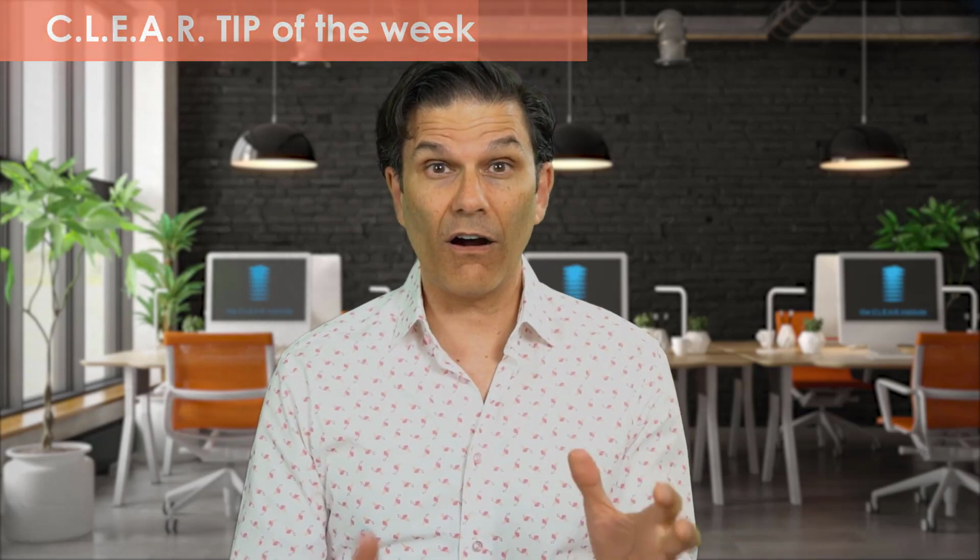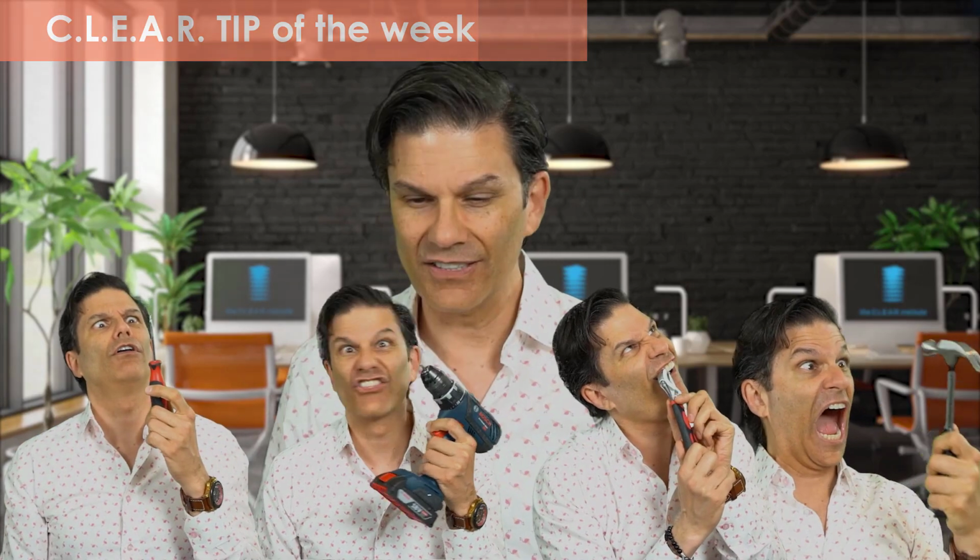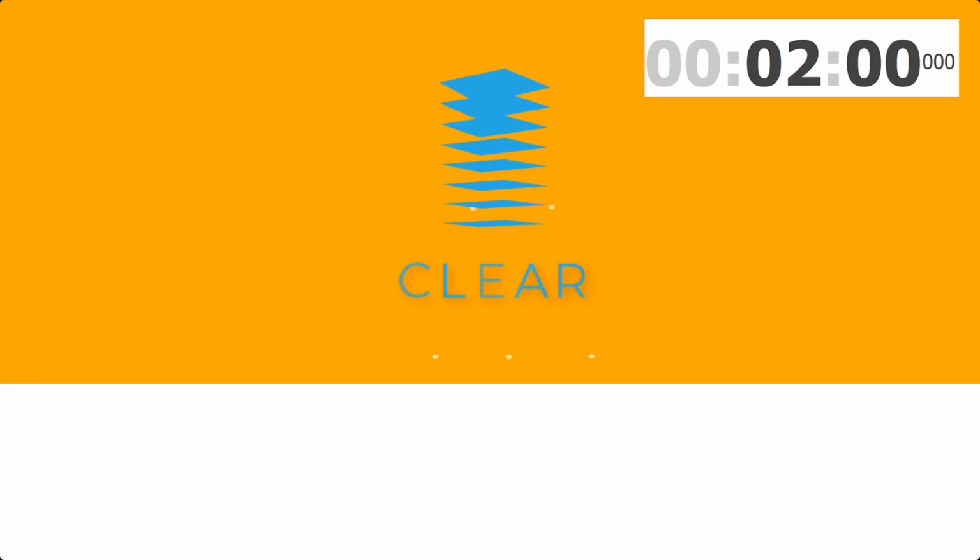Sometimes wonder, where are your tools? No, not these tools, your ClinCheck tools. And why you don't have the same ones on every computer you use? Here are the answers in this week's clear aligner tip in less than 2 minutes. Let's start the timer.